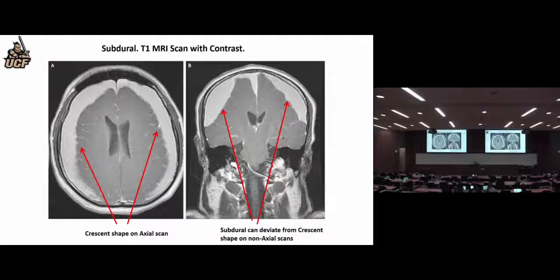And an epidural cannot ordinarily go through these like a subdural can. I mean, it's possible if you really ripped apart the meninges so that you'd have a combination of both of them, you could rip the connections out or something like that, but it's very rarely done. So if something goes the whole length, or even through where, I think, that's a suture line where my arrow is, an epidural wouldn't do that. So even apart from that, you can tell a subdural from an epidural.